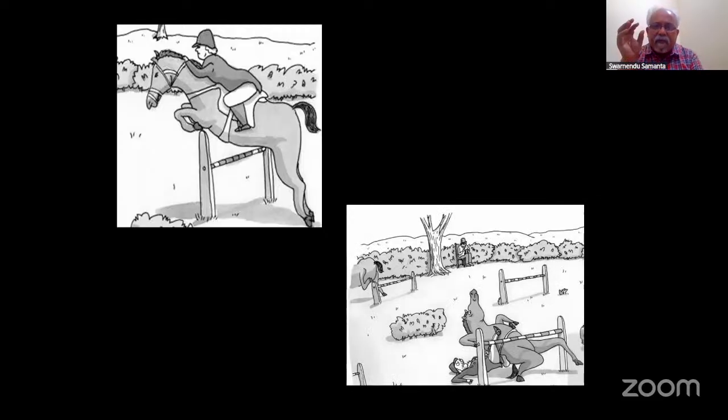So this is a very crisp presentation, which is basically needed for your exam purpose, because bone tumor as such is a very big topic, because of all the investigations. The X-ray is the first picture that we take, but to reconfirm we sometimes do a CT scan, we do the MRI, we investigate with nuclear medicine, then we do the blood investigations and all this. I am just giving you the first information that you get from the history, and you take the X-ray. Once you take the X-ray, you try to answer these basic 7 questions.